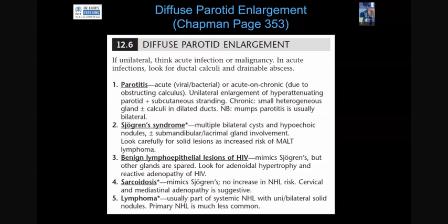Basically, pathologically speaking, what happens is that there is destruction of the parenchyma, and there is dilatation of the intraparotid ducts. And this presents as these punctate, small cavities. And there are various grades, which I am going to show you. Please also remember that there can be also deposition of lymphoid aggregates, and you have to rule that out, because that will be what we call soft tissue nodules.